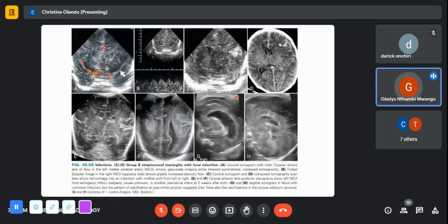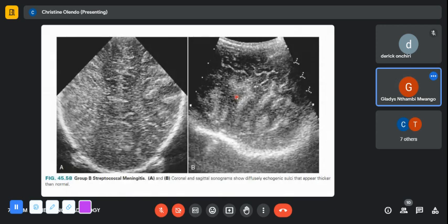So why do they have that appearance? Because of the infection of the meninges, you have increased products of inflammation. So the meninges are thickened. The CSF could be purulent. Sometimes there may be echogenicities in the CSF. If there's ventriculitis, you'd even see the ependymal lining thickened, and you can also see echogenicities within the CSF fluid. So all those factors combine to create that appearance.